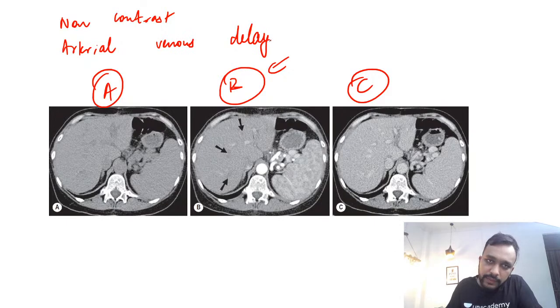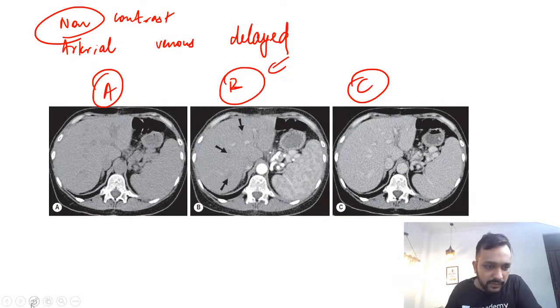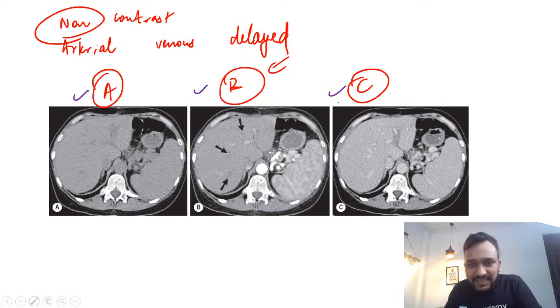Within these options you have to help me out, which are the phases being shown to you in these sequences.